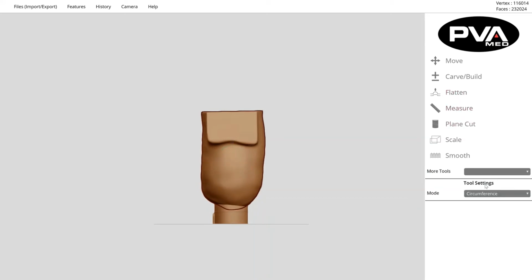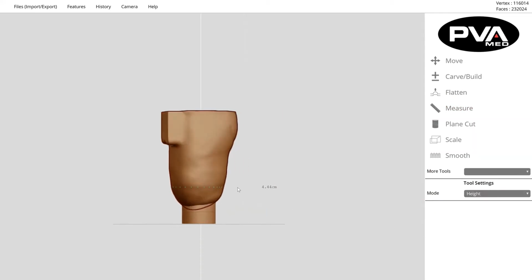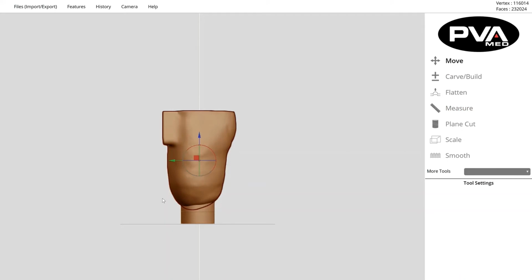We'll drop that virtual laser or plumb right down through the model, through the distal attachment, with a few more adjustments perhaps. And as we adjust that, we'll move the puck over a little bit on the distal attachment, and then we'll do another check with the measurement tool and see if we're getting close here.